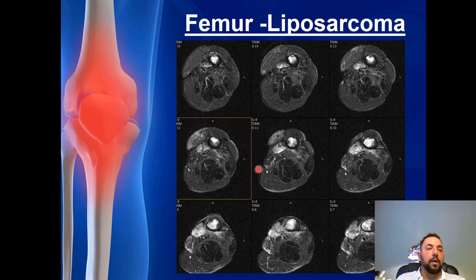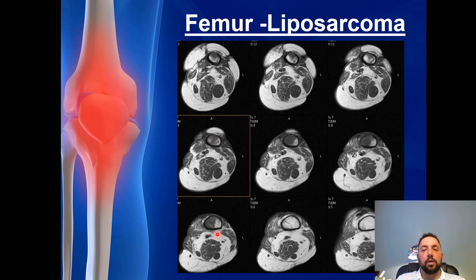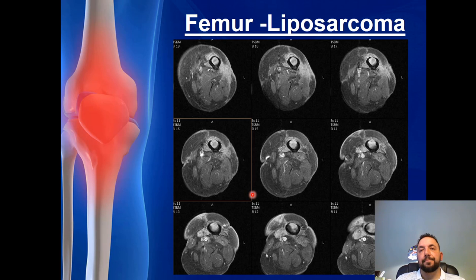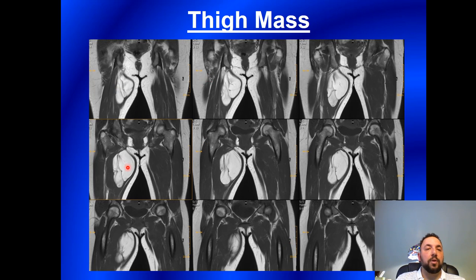Very similar to the lymphoma case that we looked at in the humerus, liposarcoma, where you have invasion with this malignant pathology in both the bony abnormality as well as in the surrounding soft tissues. So liposarcoma is a condition that affects both bone and soft tissues. It will be T2 bright and T1 dark, and typically has a pretty significant enhancement if contrast is administered. And this looks like this would be the post-contrast imaging, where you see the enhancement within the specific area of malignancy.